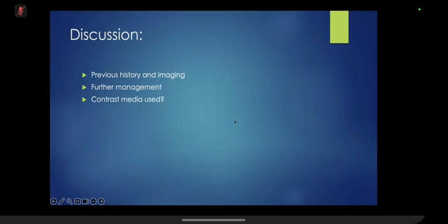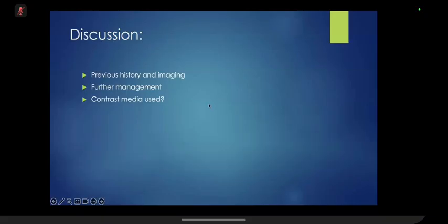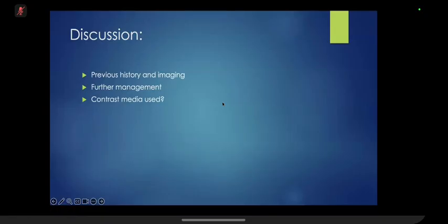Regarding the classification of the fistula, we try to avoid doing that, because the primary physicians don't like it when we classify it on our films. And in this case, we didn't have the preoperative imaging available. It was done outside. The surgeon was from outside, but when the patient had surgery, the parents noticed that it was not improving and wanted to check, so they referred the baby to our hospital. So we didn't have the preoperative imaging. Otherwise, I would be so happy to show you the preoperative imaging as well.